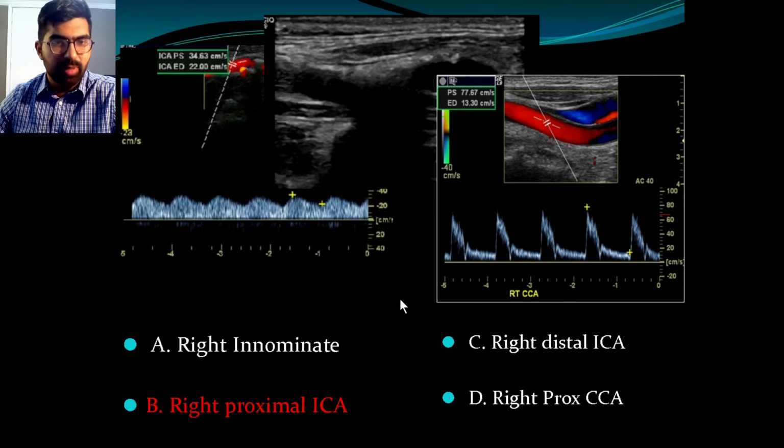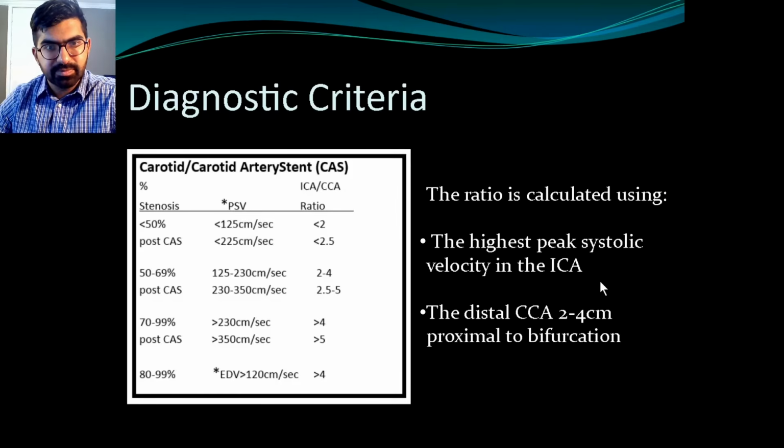And so why can't you see it? Well, the calcification is blocking that. So again, very, very important concepts. If you really wanted to quantify it clinically, you'd have to get a CTA to see what it looks like.